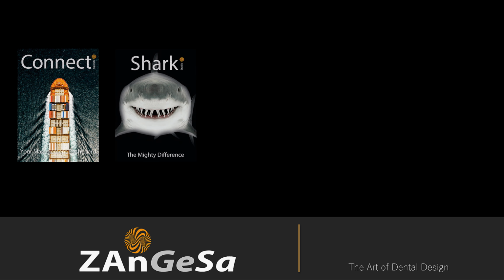Shark Studio is a computer-aided design software, which offers you the fastest and most efficient way to a full denture. You can start with an impressions model or intraoral scan. The selection and alignment of the teeth rows is based on the information obtained from the patient.